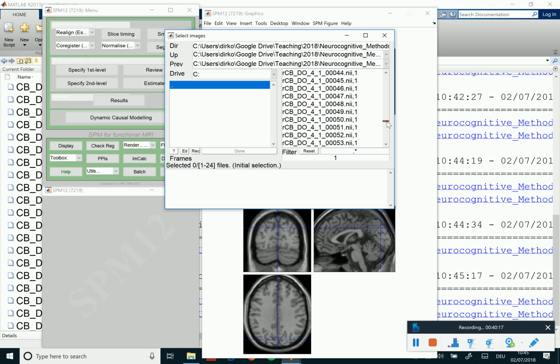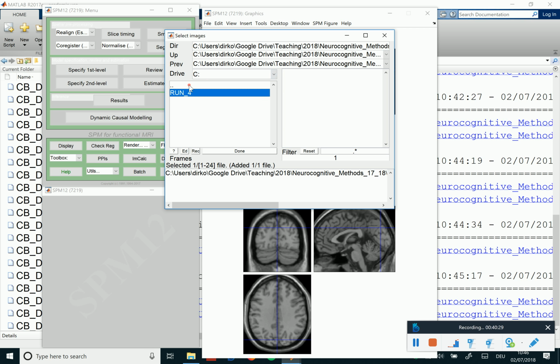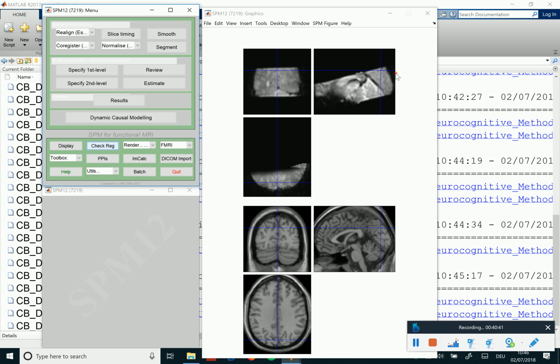But you also saw it in the beginning, it didn't look realigned, right? Or you didn't realize anything, you're just staring in the air. Or it didn't look normalized, sorry, not realigned, normalized. So maybe I just looked at the wrong image. No, let's stop this because otherwise I'll just confuse you more.